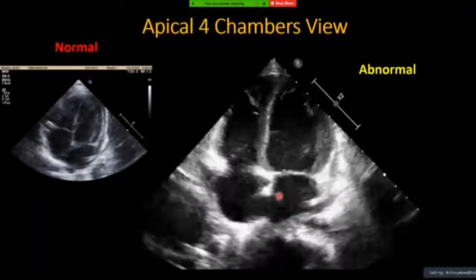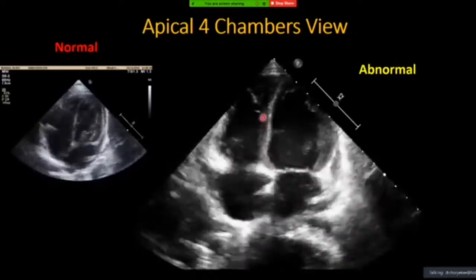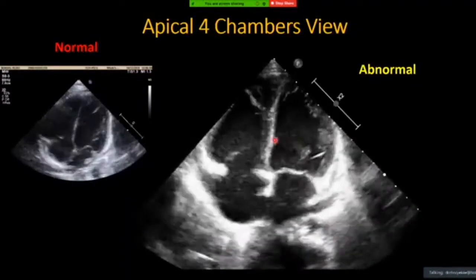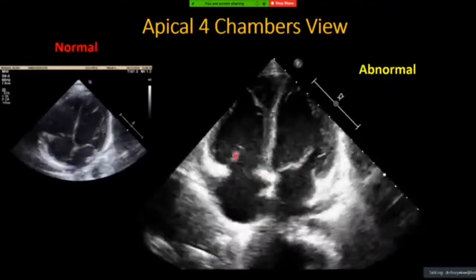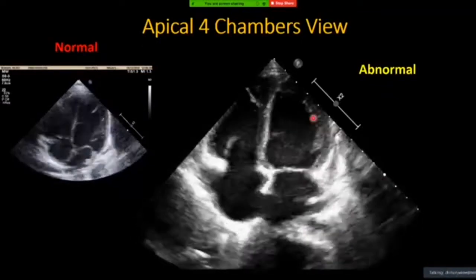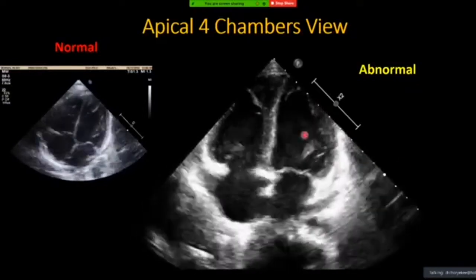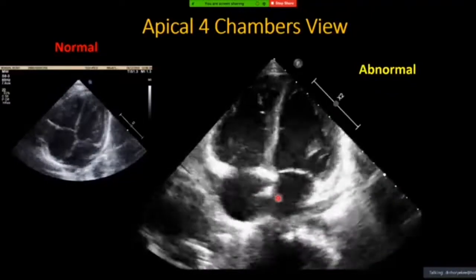So this is from the first instance. All the chambers are big and not much variation in terms of the size. So that is in terms of the chamber. But otherwise, when you compare left and right, they are nearly equal. So which means nobody wins. So all of them are very well filled. So no one is dominant over the other. Okay, so that is in terms of chamber.